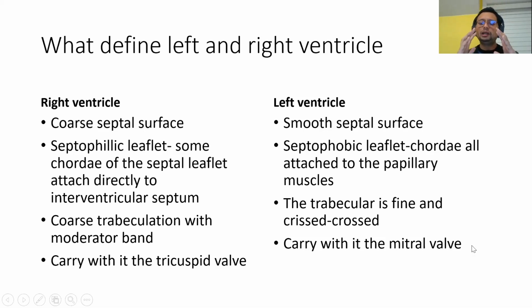So if you look at the apical 4-chamber view, which ventricle has the more apical insertion of its leaflet, meaning the tricuspid valve? That is the right ventricle. Therefore, one of the clues that you are looking at a condition called congenitally corrected transposition of the great arteries, in which the right ventricle goes to the left and the left ventricle goes to the right, is that in the apical 4-chamber view on the left side, the leaflet is attached more apically.